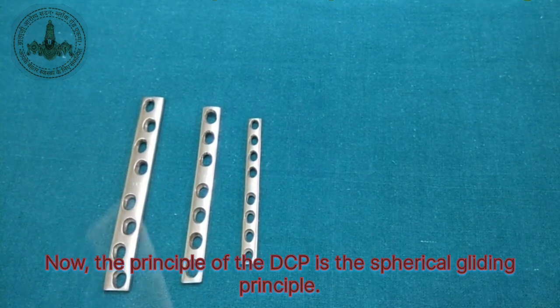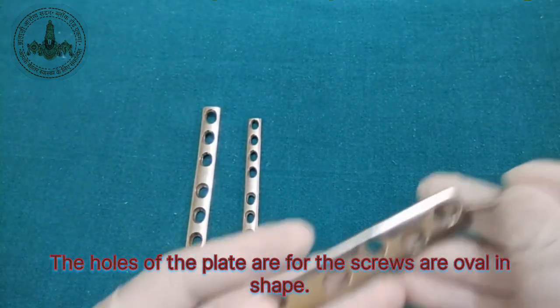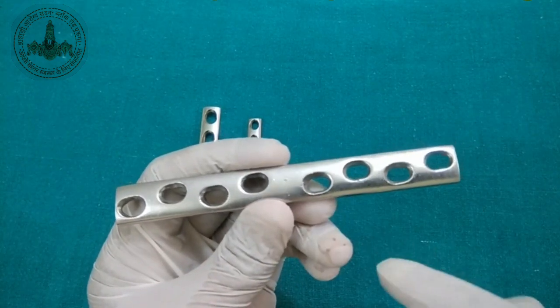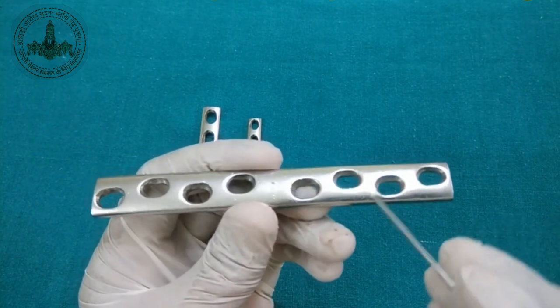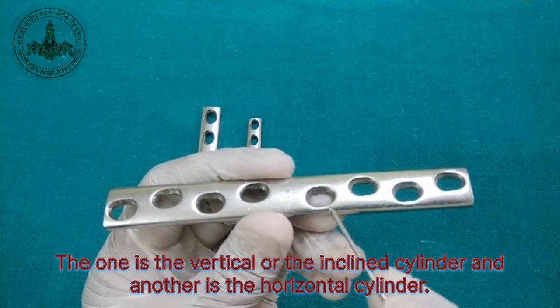Now the principle of the DCP is the spherical gliding principle. Just see here, the holes of the plate for the screws are oval in shape. They are not circular, they are oval in shape, and they are a combination of an inclined cylinder and a horizontal cylinder. The one is the vertical or inclined cylinder and the other is the horizontal cylinder.